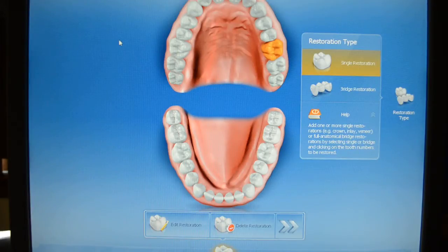So that's number 2. And number 3 is if I'm working on multiple teeth, I may have a diagnostic wax-up from my lab, whether it's in the posterior segment or the anterior segment. I can save myself a lot of time by taking my pre-treatment pictures off a model when my patient isn't even there, and then all I have to do is shape teeth and take new pictures of my preparations when my patient is there. So biogeneric copy is a really fast, very effective tool and mode to build teeth.